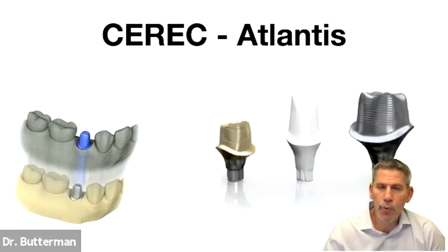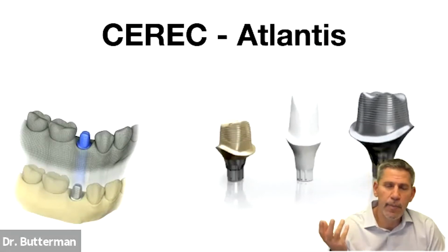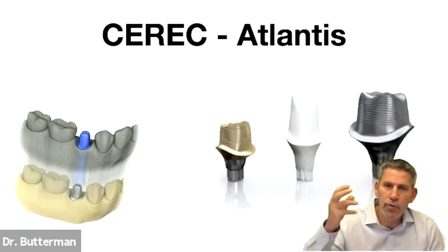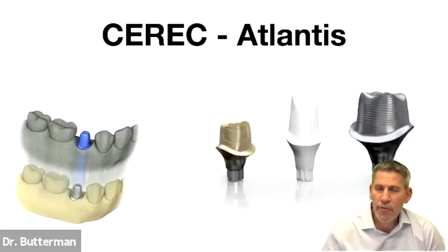But there are multiple ways to restore implants with CEREC. One of them is using a Ti-base. I won't be speaking about that tonight, but the premise behind it is you purchase a titanium base specific to your brand of implant. You scan that with a scan body in the patient's mouth, and then you design either an abutment or a screw-retained restoration that you then bond to that Ti-base and bring to the patient's mouth. The workflow that I'm doing probably 80% of the time at least, though, is an Atlantis workflow.